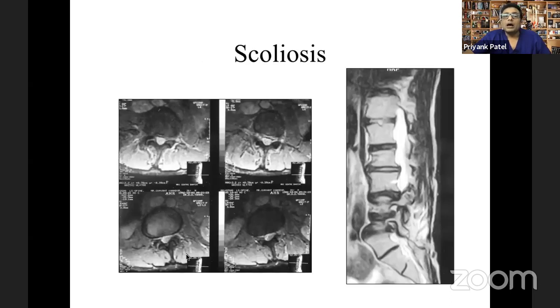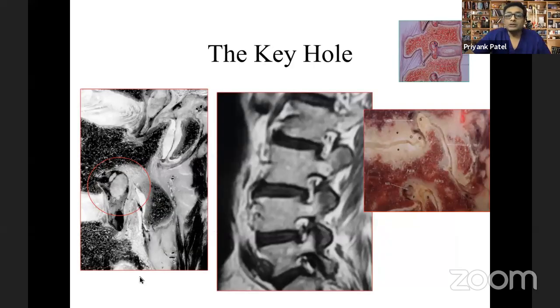The parasagittal sections, or technically the sagittal sections, are not very useful, except in cases of scoliosis, because in scoliosis you have a crooked spine, and when you have a crooked spine, what happens is that when the cut happens in the spine, at some place you see the mid sagittal and some place you see the parasagittal. Don't really get confused about all these things. Later you'll understand what is the importance of what.